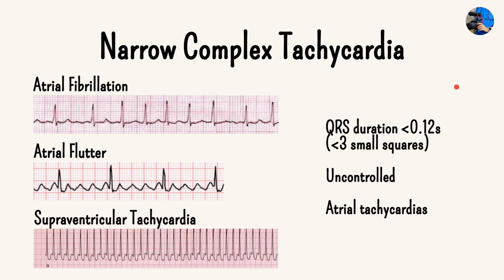And you can see in atrial fibrillation that it's irregular, okay? And it's irregular in that you can see that if you counted the number of large squares between peaking QRS complexes, that's irregular. I mean, that's 2.5 there, hardly 2 there, 1.5 there, maybe 1 there, 1.5 there. It's all irregular. It doesn't take a genius to see that. But you need to understand what's actually happening.